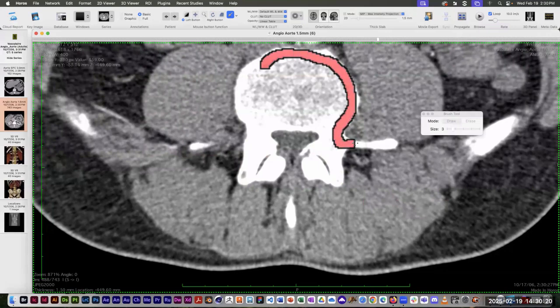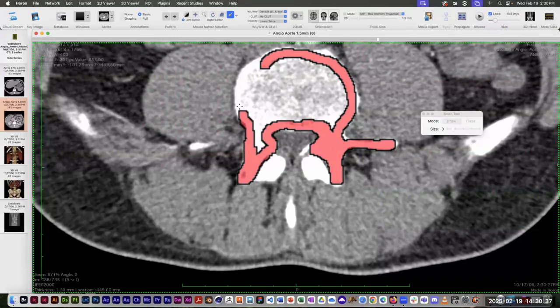All right, and I realize now that my transverse process is sticking out from the side near the lamina and the pedicle. I think I had seen part of that transverse process in the previous slices, but it was disconnected, so I wasn't sure if that was part of the transverse process of this vertebra or a different one.